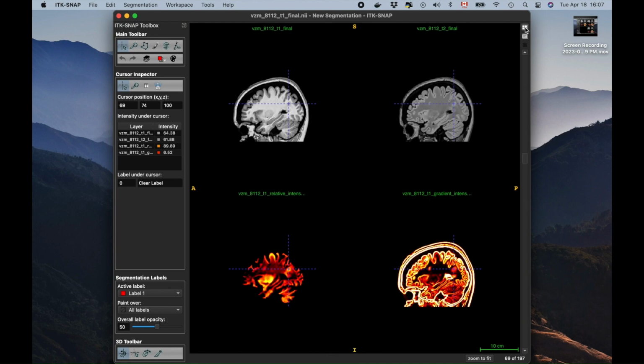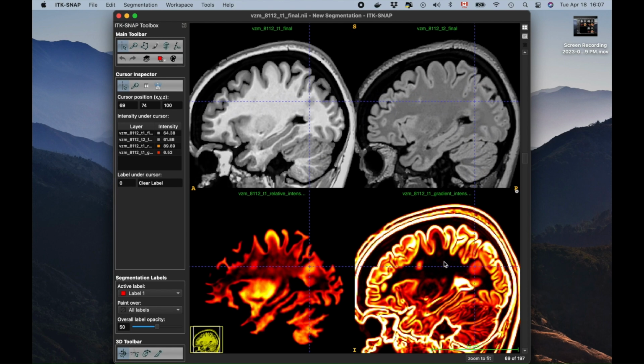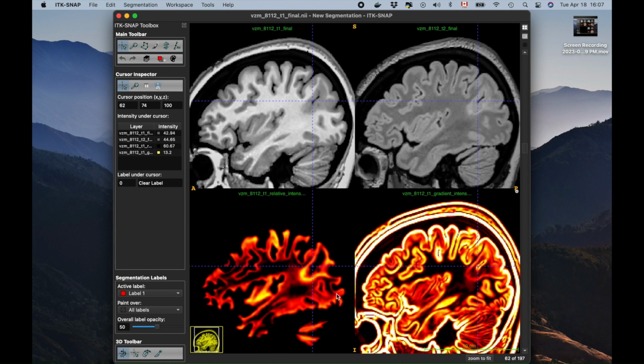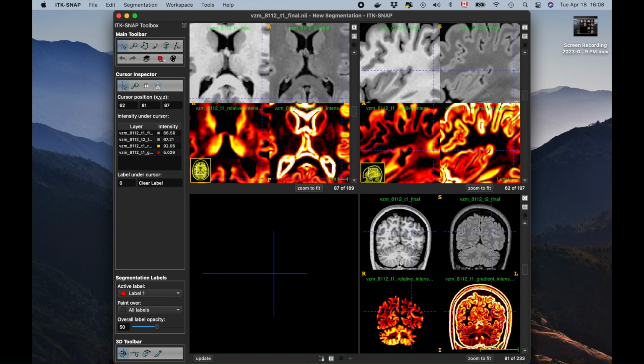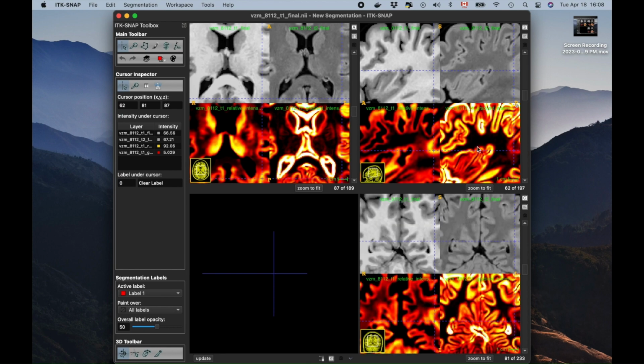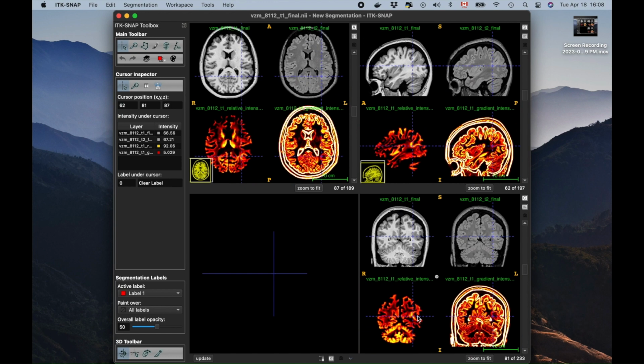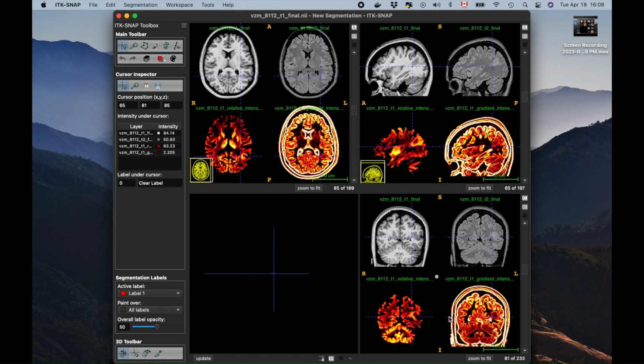But if you move around, you will see that that is getting much more convincing. And then also, in this case, if we look at the coronal view, we still have the same signs. So we can confidently say that in this very location, there is an FCD.